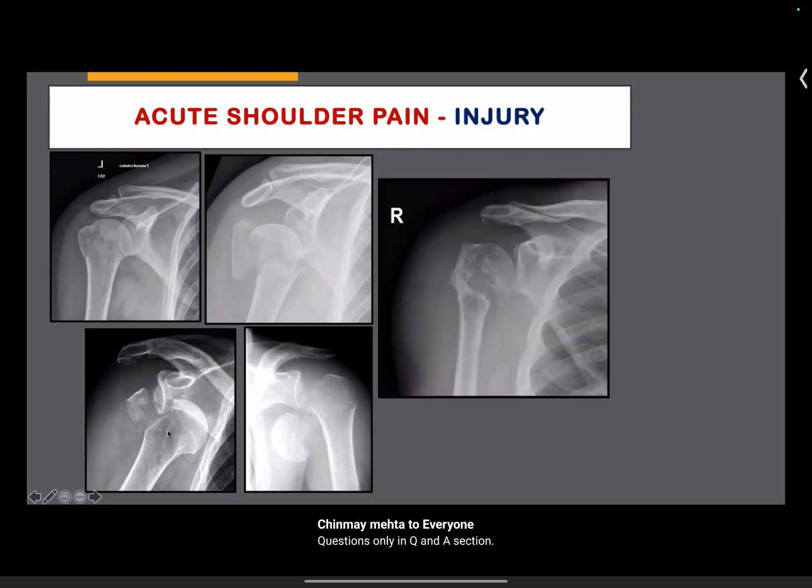Okay. But what about this? If I tell you this is a 70-year-old with shoulder pain, and this came from an orthopedic surgeon, and if you look, the bone doesn't look right. The fracture is not a typical kind of fracture. There's a bit of band-like lucency there. But for the clever eyes, you can see a bit of periosteal reaction there. It's quite swollen, whether it's a hematoma or it's something else.